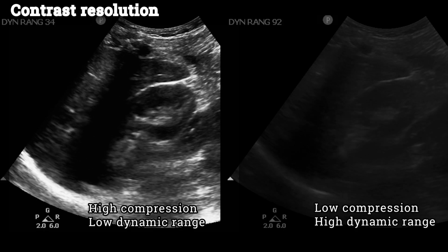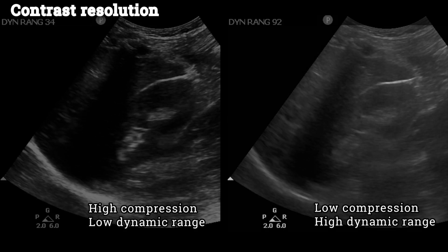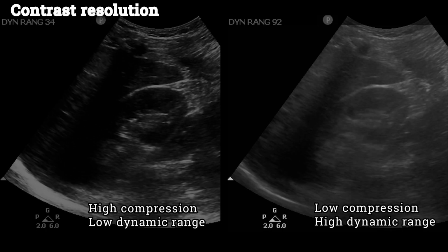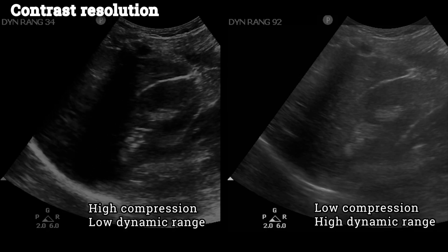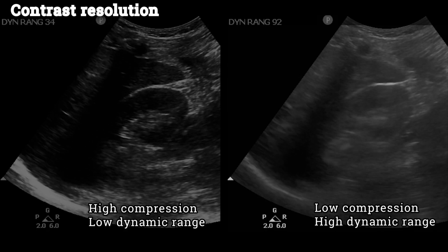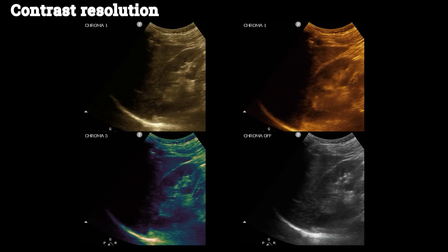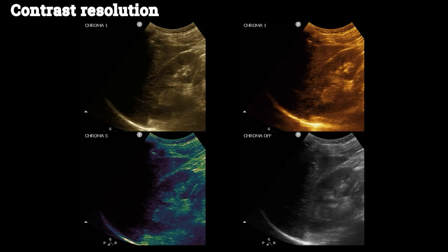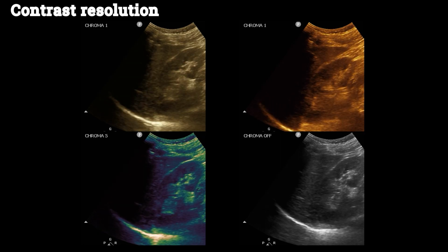At the other end of the spectrum, low compression widens the dynamic range and displays an image with many shades of gray. Increasing the dynamic range allows you to see very low and very high amplitude signals on the display, and thus a wide range of grayscale. Borders appear grainy or blurry. Chroma maps. Contrast resolution may be enhanced by changing the chroma map of the display, so it may be easier to distinguish between shades of color instead of shades of gray.